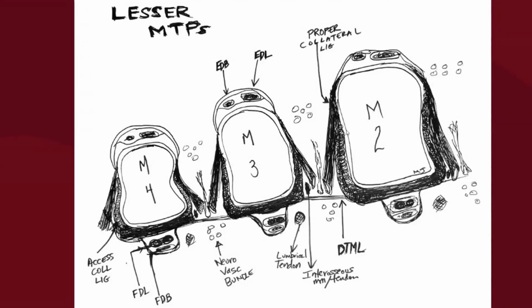In between the articulations of, say, M2, metatarsal 2, and metatarsal 3, we have the metatarsal bursa, and that's a potential space that can become inflamed and enlarged during times where we have rotational or increased stressors at the metatarsal head. Of course, I've left out, let's just go through the entire bit of anatomy, going through the entire circular apparatus of the axial image.